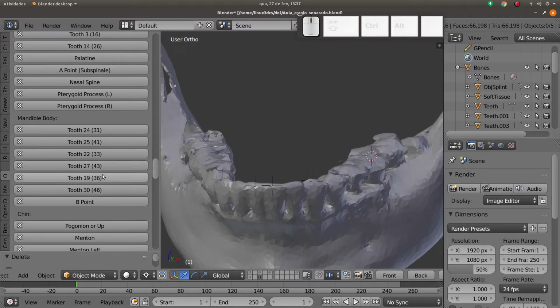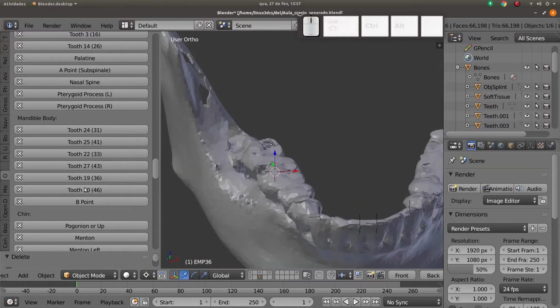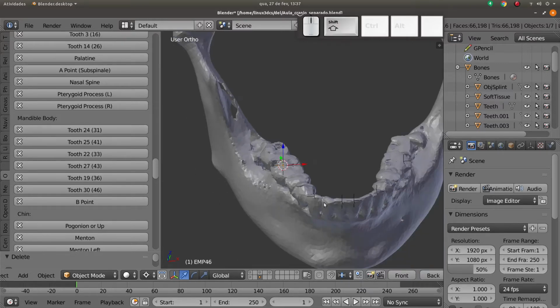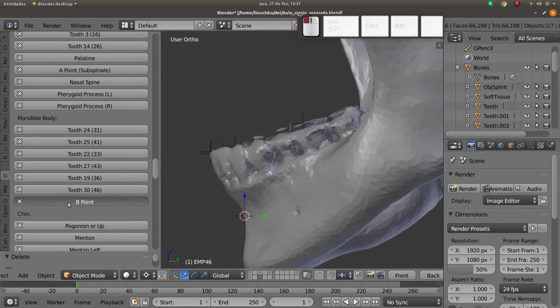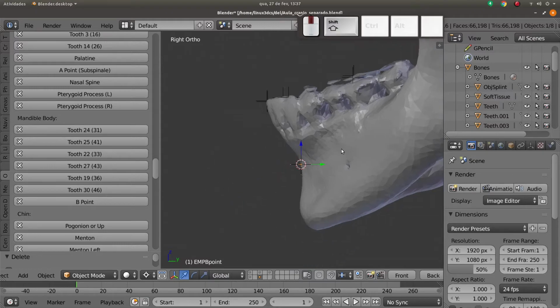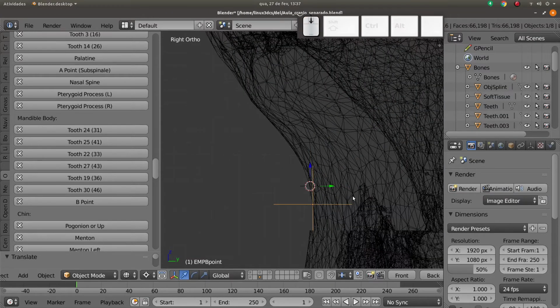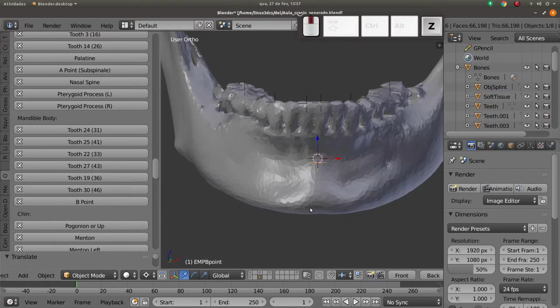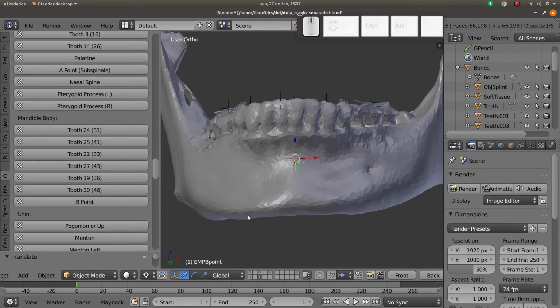This is here, 36. And this 36, because I have 2 numbers, one the international and another Brazilian numbers. And B point, I imagine more or less here. B point. If you are not certain, you can move it after, like I'm doing here. Okay. You can see in this part above.